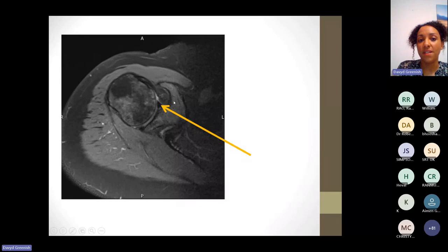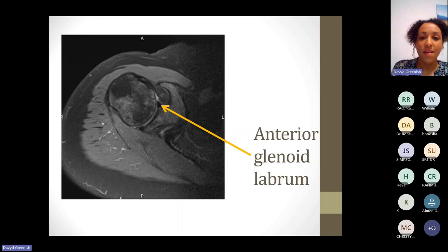We can also orientate ourselves because you can see this bone. And again, this coracoid is really helpful for knowing that this is going to be anterior. And I think that's important when we're trying to be specific about this structure. So I'm going to keep going.